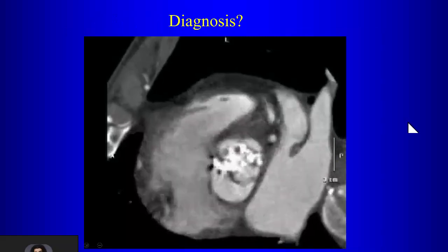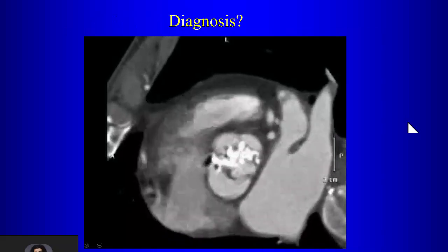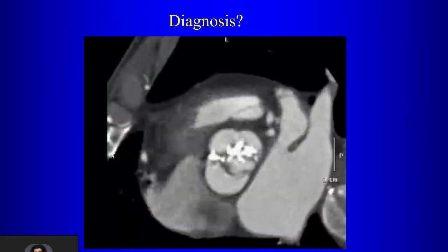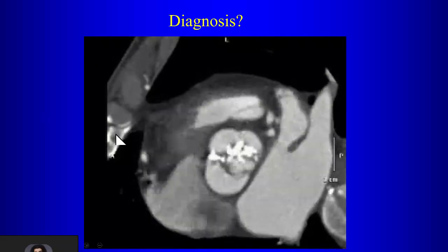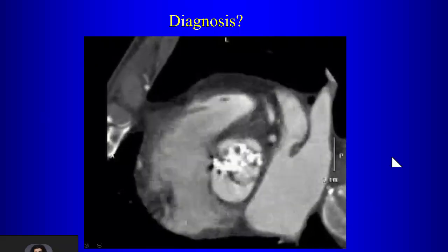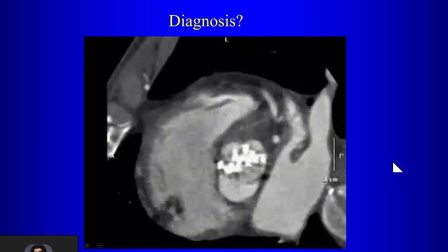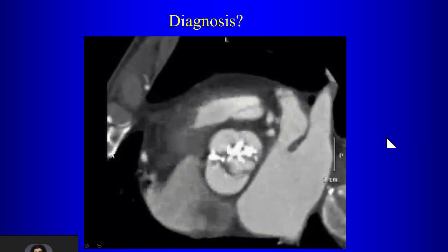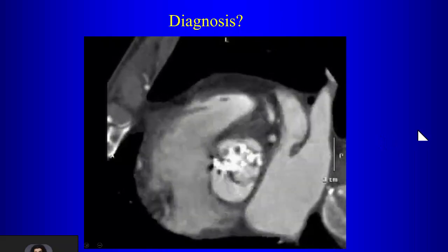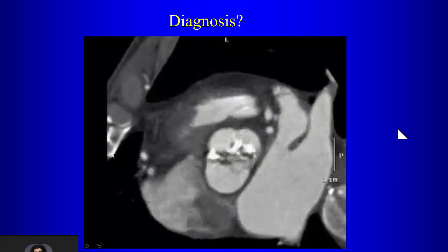And what kind of study is this? Is that an MR? Oh. What is it? Yeah, I mean, look at the bones, right? See the bones there. Okay. So that's a CT scan. It's a cardiac gated CT, right? And what does it show? Yeah, so we can see the aortic valve is not opening all the way. Does it show anything else about the aortic valve? Yeah, it looks like a bicuspid valve, and there's also extensive aortic valve calcification that doesn't surprise you. So in this case, this person has a bicuspid aortic valve with extensive calcification.